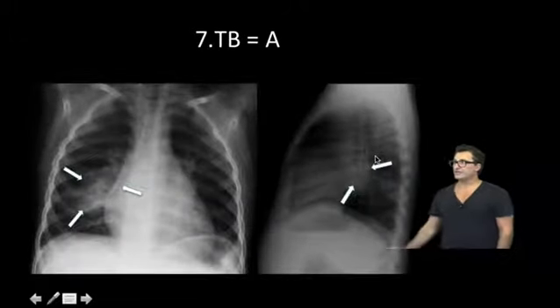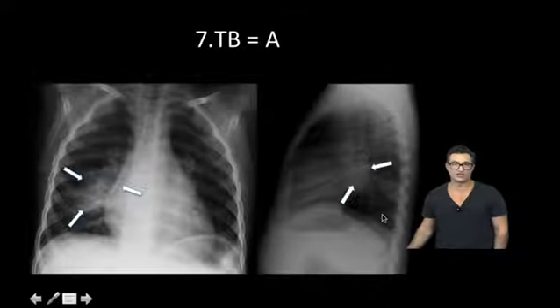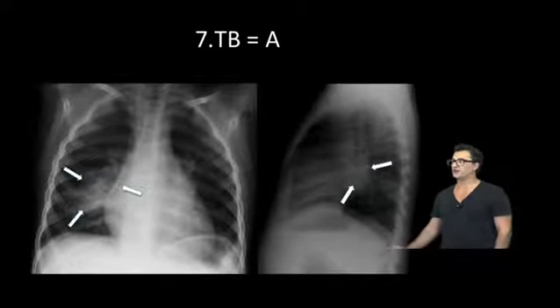I call this TB. I've outlined with 3 arrows what I think is a parahilar mass. And of course, I've got a lot of confidence in that because I've got the bottom half of a very skewed donut, yeah? So the lateral is very convincing in my opinion.